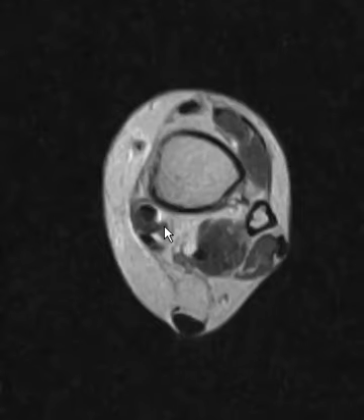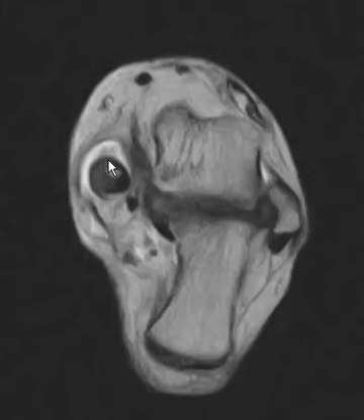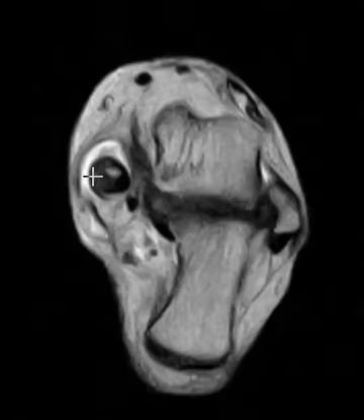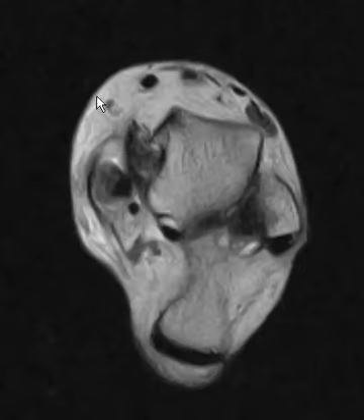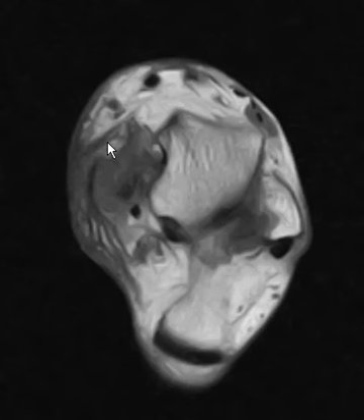And also there's fluid in the tendon sheath, so tenosynovitis. So it looks like she's probably had a chronic hypertrophic tendinopathy, and lately she's developed this tenosynovitis and this prominent fluid in the soft tissues, or edema rather, within the subcutaneous soft tissues. Shows up a little bit better in this T1 weighted sequence. So an example of hypertrophic tendinopathy without tendon rupture and tenosynovitis in this woman with a flat foot deformity.